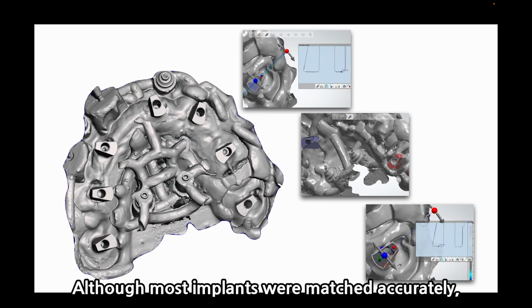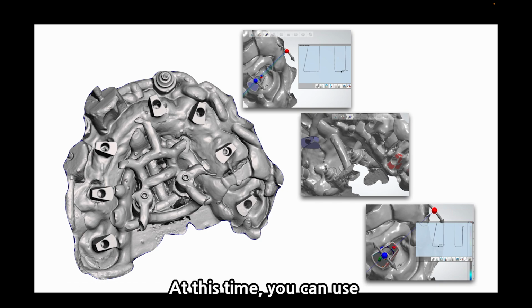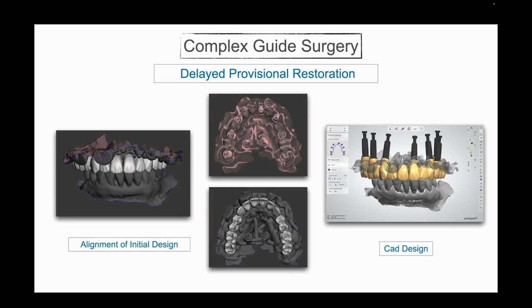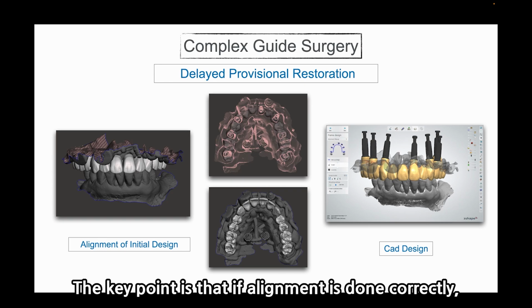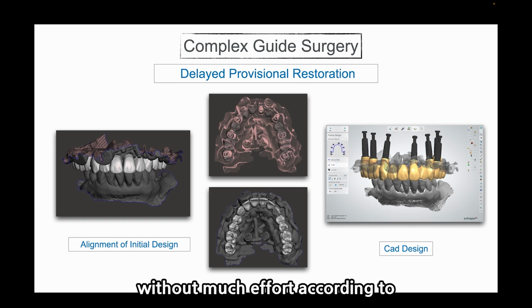Although most implants were matched accurately, some were aligned within 5 to 10 micron deviation. At this time, you can use area-based local best fit alignment. This is the CAD design process of the prosthetics. The key point is that if alignment is done correctly, the temporary prosthetics can be designed without much effort according to the restoration plan for surgery.